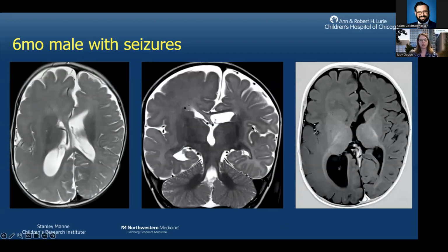Sometimes it might be hard to tell in these cases which side is abnormal and which is normal. So with hemimegalencephaly, it's going to be the larger side since it's a hamartomatous overgrowth. So here we can see the right cerebral hemisphere is asymmetrically larger than the left, and even we can tell that the right calvarium is larger than the left, sorry. And usually the ipsilateral lateral ventricles will be enlarged. So here we can see, especially posterior, this right lateral ventricle is enlarged.